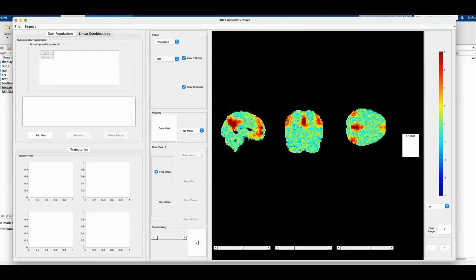Now, let's apply a threshold of 1.64. I can come down here to this box, and I can input 1.64 and hit Enter. And we can see that most of the voxels in the brain have been wiped out from the mask, but the pieces belonging to the posterior cingulate, these two lateral regions, and the frontal region have survived. So this would be our default mode network mask. And so you can see it a little bit better, say right here.